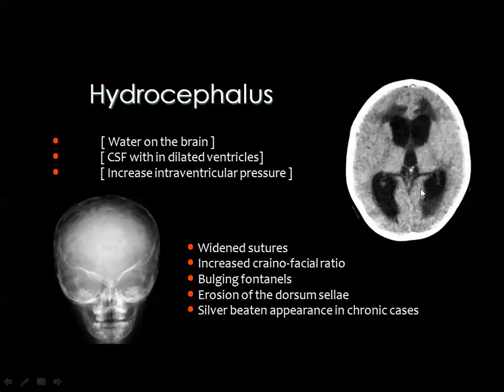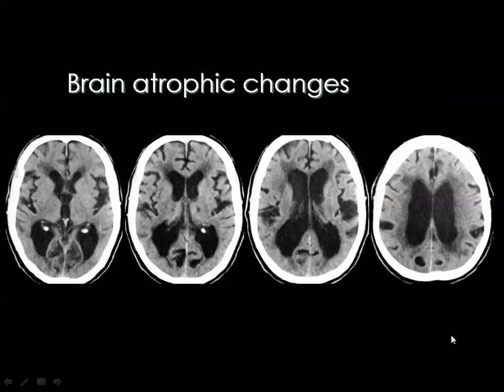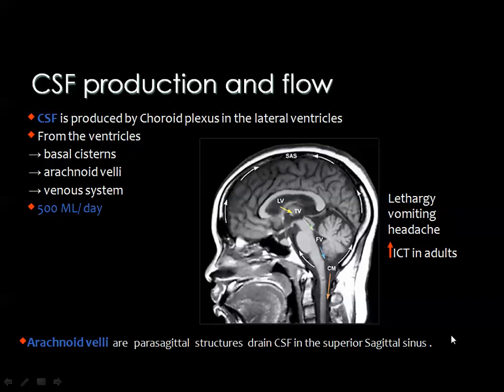And this indicates that you are dealing with a case of obstructive hydrocephalus. Then we come to the normal flow of the CSF and its production.